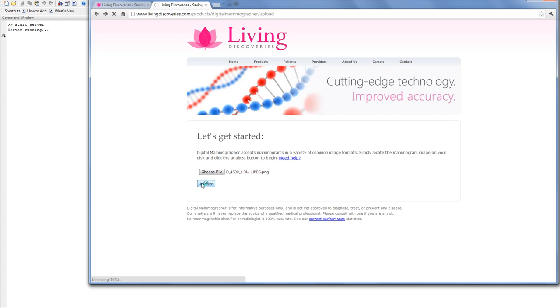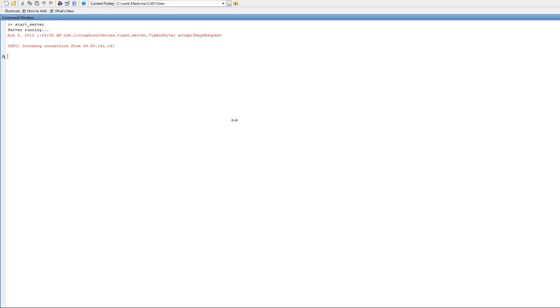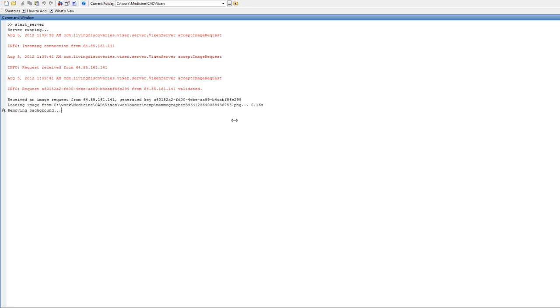And that's essentially all that I need to do. It's now being uploaded to the web server. And as soon as that finishes, the scan will start running. It will take about 90 seconds, about 1 minute and a half. And then we'll get back the result and we will see the report. So it just finished uploading, and there we are. We have a connection from the server, and it is going to town.